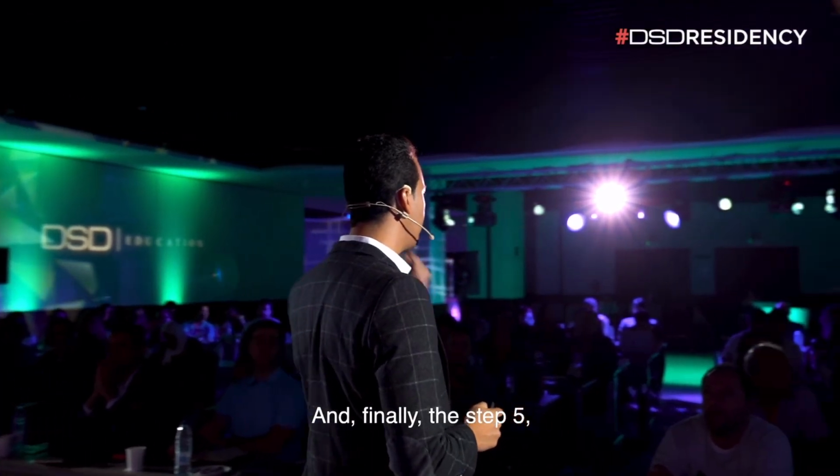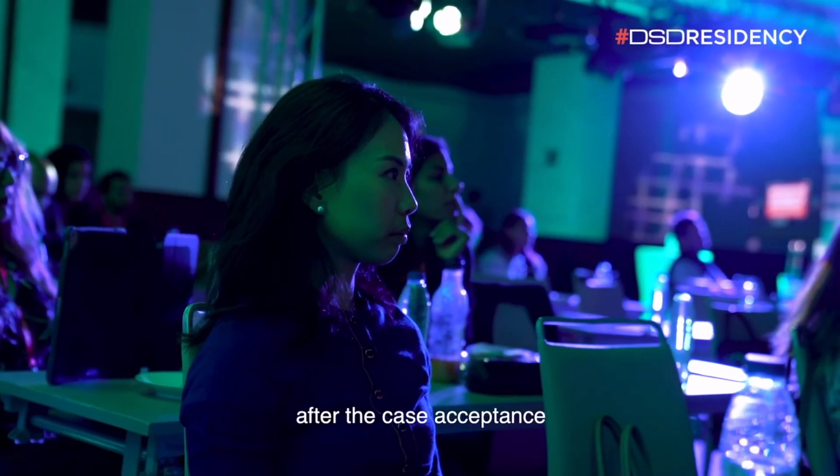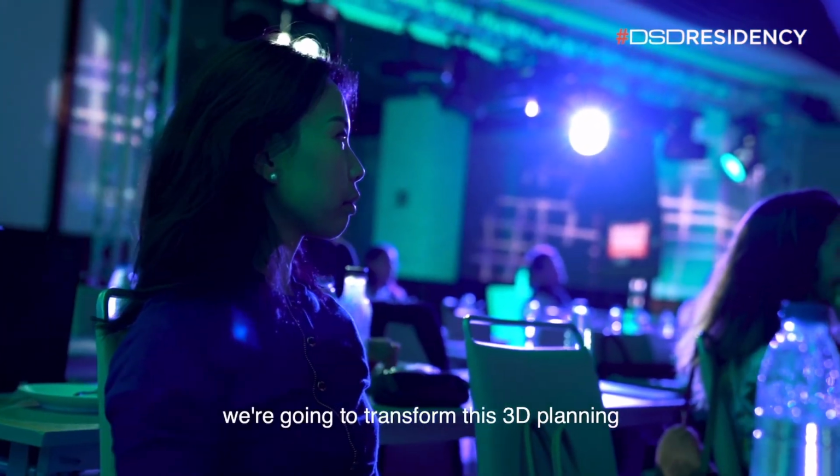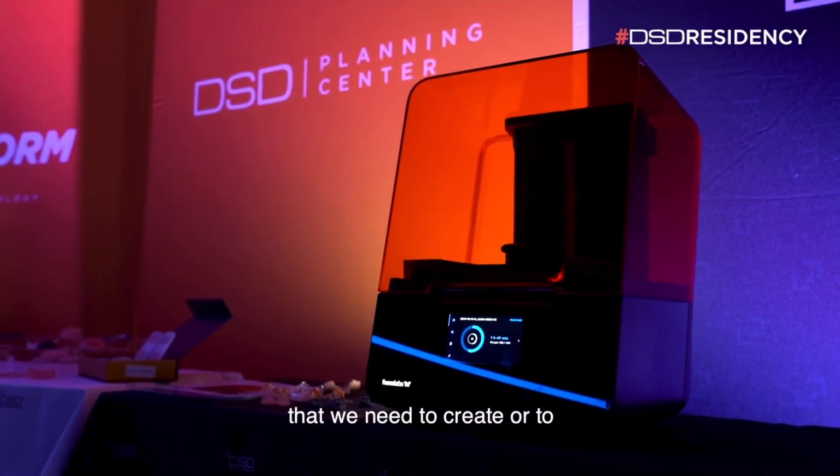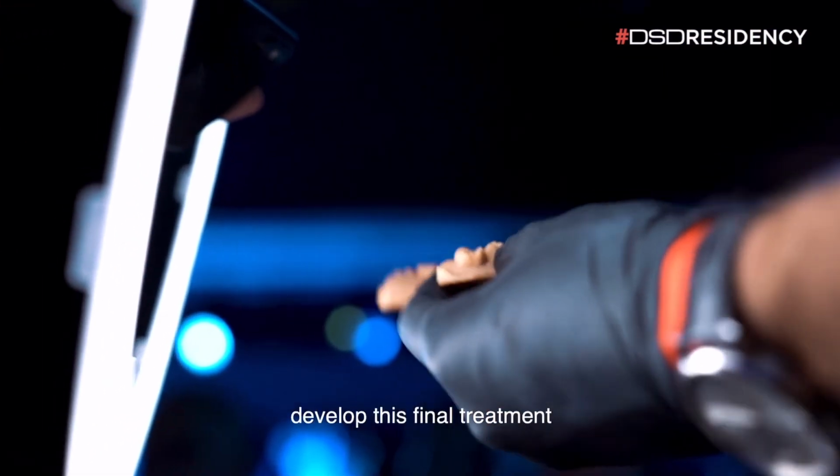And finally, the step 5, if after the case acceptance, we want to transform this 3D planning into something real. We want to manufacture all the devices that we need to create or to develop this final treatment.